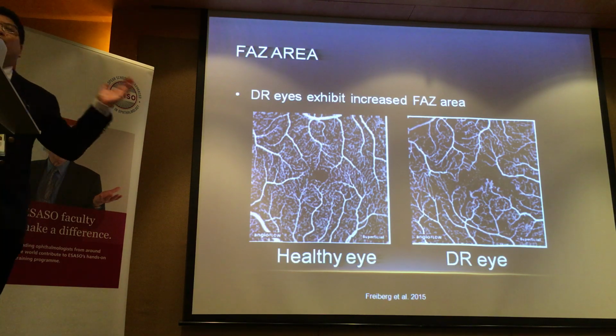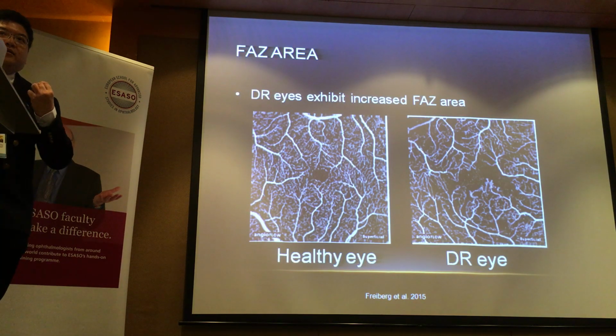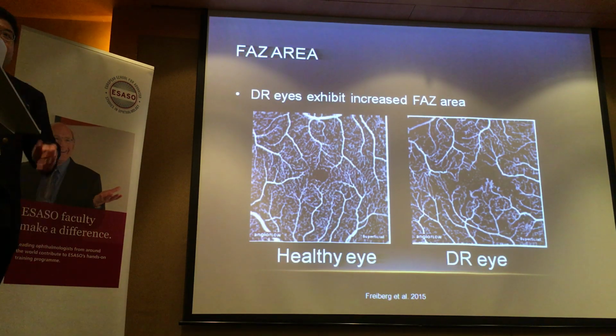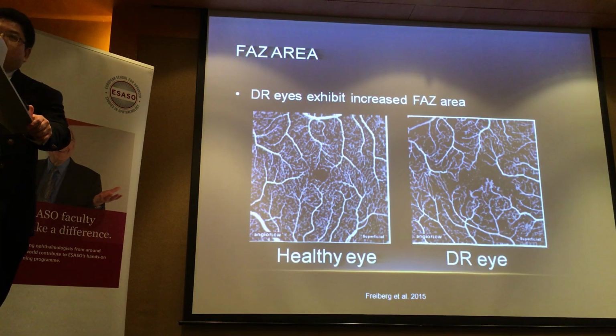For OCT, of course we want the best quality for everything, but when you have problems with the quality of the OCT, you will get areas of dropout. So if there's something that's not right here, this could be an area of dropout. I'm quite sure this is, frankly, I will bet on it. But this area, it could well just be the quality, especially at the periphery of an image. Right? So that's one of the limitations, which is a bit unlike a fluorescein angiogram.